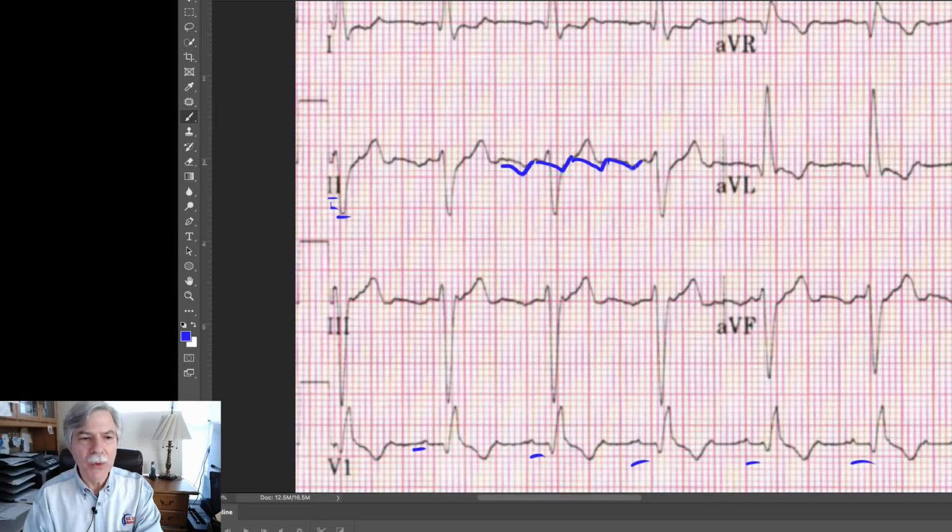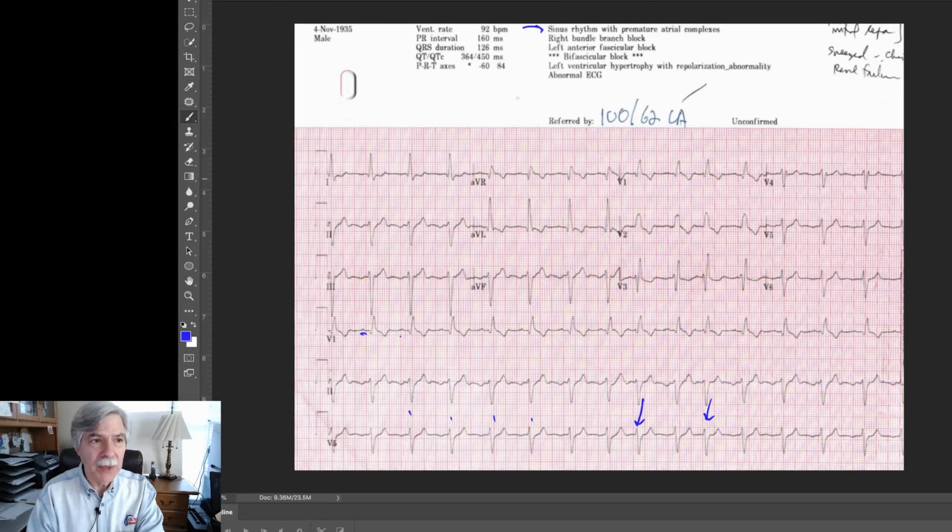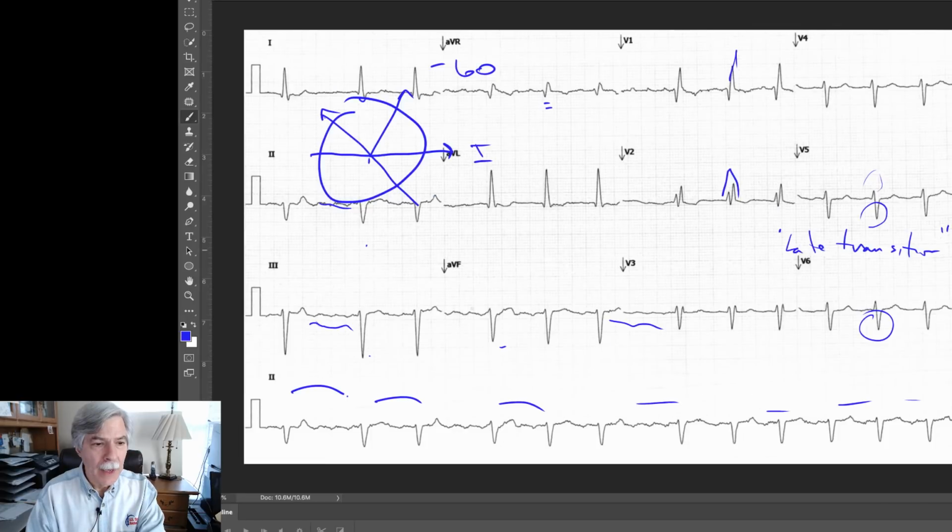Those of you who are used to diagnosing atrial flutter will recognize this right away. Those of you who are still beginning in ECG analysis, maybe it's a little bit more difficult, but let me show you the original cardiogram that was sent to me by the doctor. If you look here very carefully, there's a lot of artifact in the baseline, a lot of very small high frequency jiggles, but you can still see the sawtooth pattern in the baseline. And you can see it here as well.